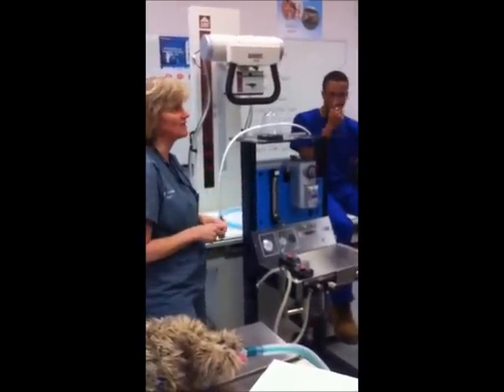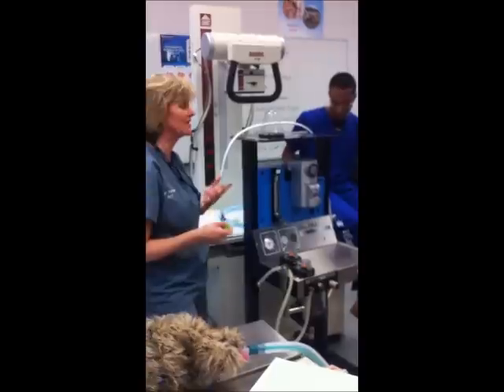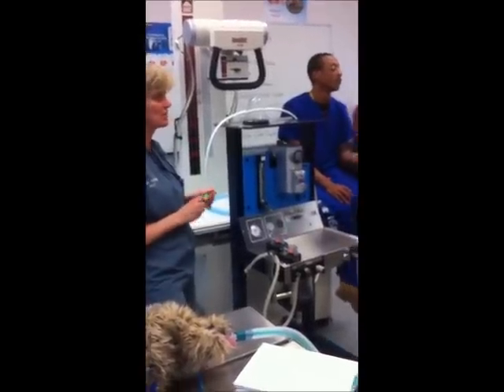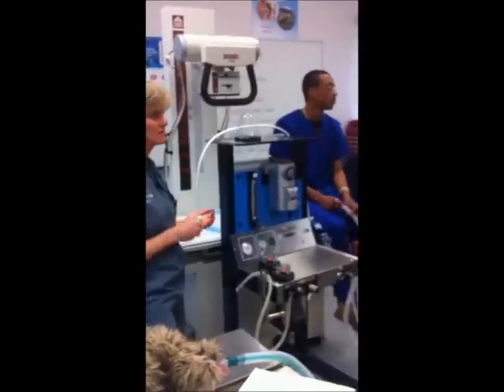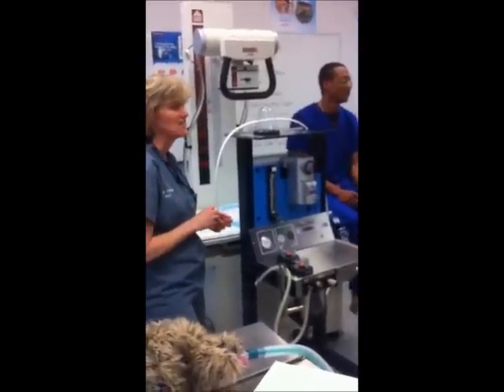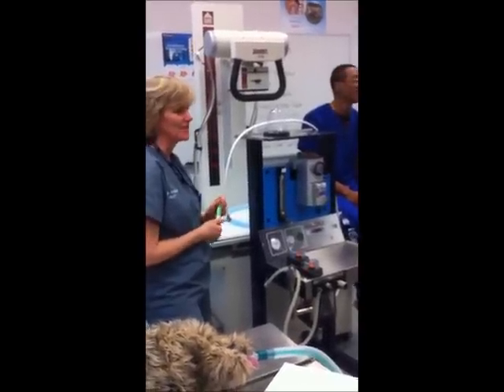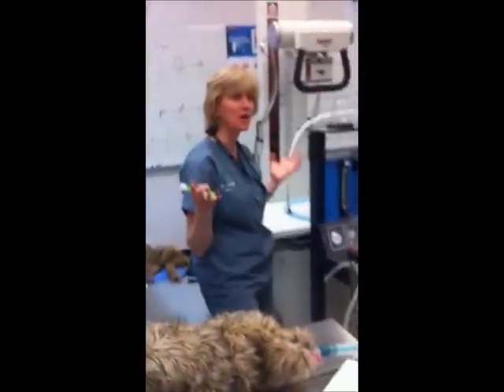But don't use that as a reason to say, well, I guess I won't study the induction equipment or the monitoring equipment, because there are going to be other questions on the written test. The induction, the Doppler. You might need to do some study before next week. What else? You tell me, what other pieces of monitoring equipment have we used?